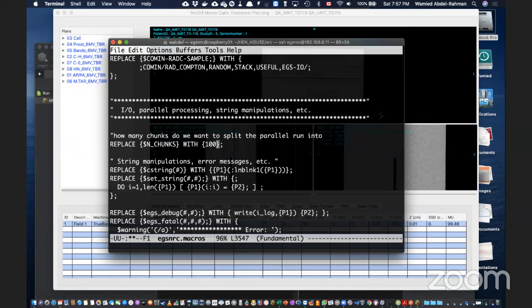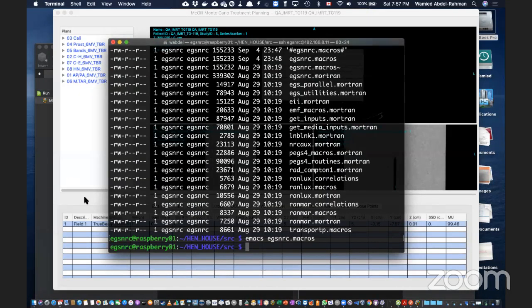It's up to you, because I like to actually see the update, the progress. I am impatient. I want to see the progress going. So if we keep it at 10, then I'm not going to see a change, although the simulation is actually running, until after a while. So I like to change this to 100. Okay, but it's up to you. This is not important. It's not really important at all.